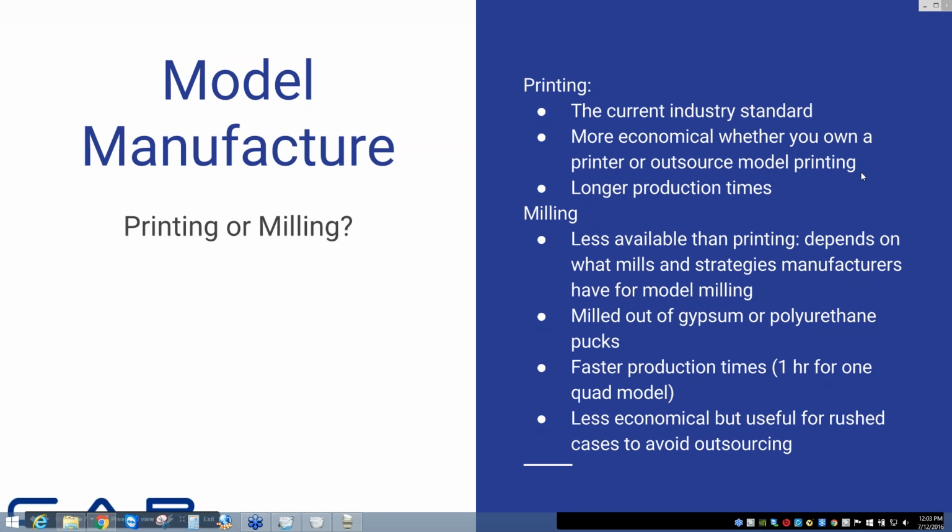Okay, I see a question from Michael. He was asking if this was an intraoral scan or a scan of an impression. Both of the cases are from intraoral scans. I believe both were from Trios originally, but the second one was from a converted STL file.